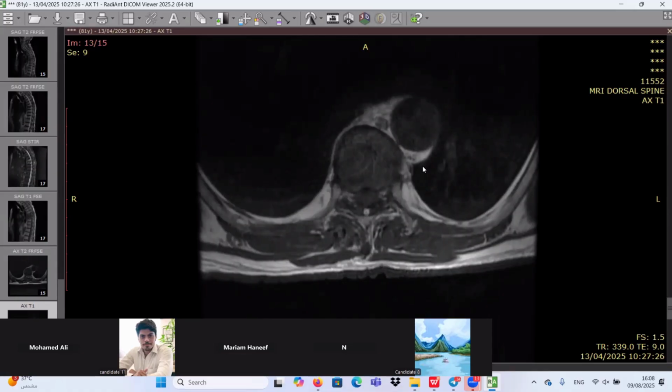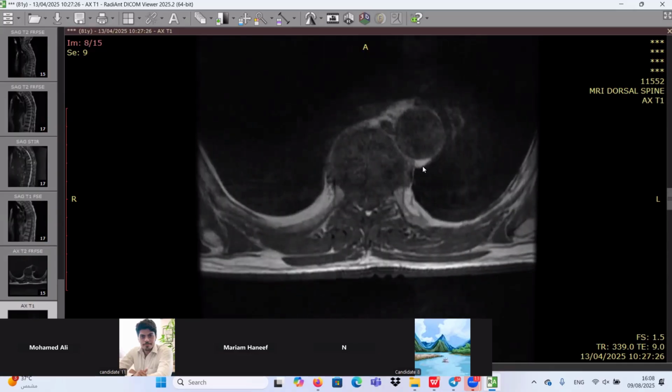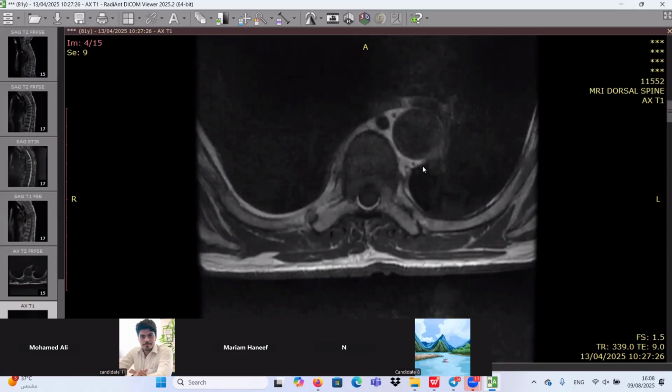This is a border of the vertebrae, and this is fat. Okay. By this area, look for this one. We have soft tissue sheets. Yeah, there is bilaterally on the lateral side and the anterior as well. Yes. Okay.